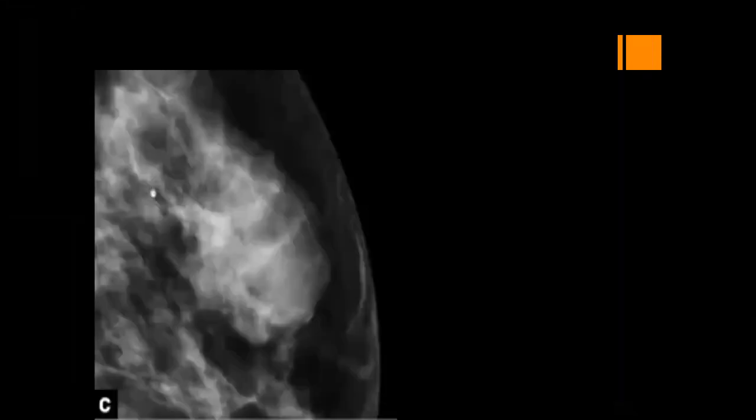What about these lesions? Do or not do? Still we are in BI-RADS 2. You have to do an ultrasound first because this is a circumscribed, partially obscured, high density lesion.